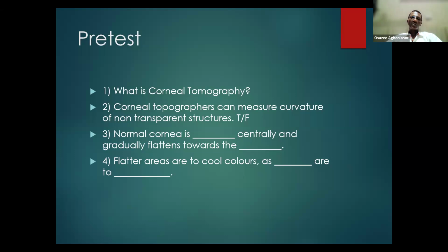So outside the regular OCT that we have, even the OCT is also limited because not all OCTs give you anterior segment information. Some of them are just for posterior segment evaluation, and just a few of them can still give you anterior segment information. So topographers that have the ability to do the posterior segments are few, and they're usually the modern types. I don't know if that answered the question, sir.